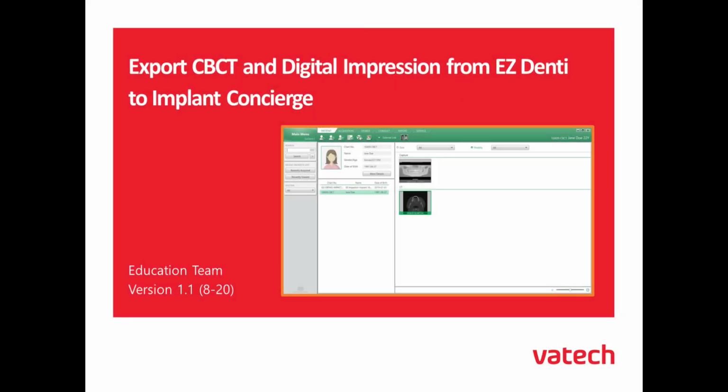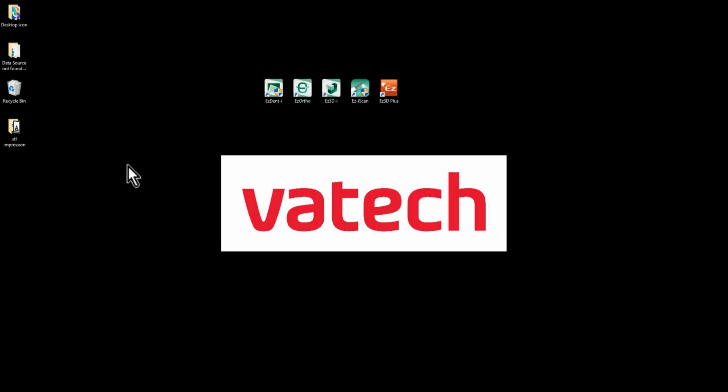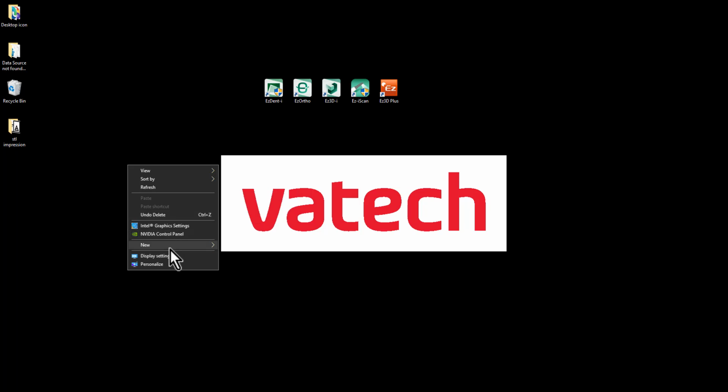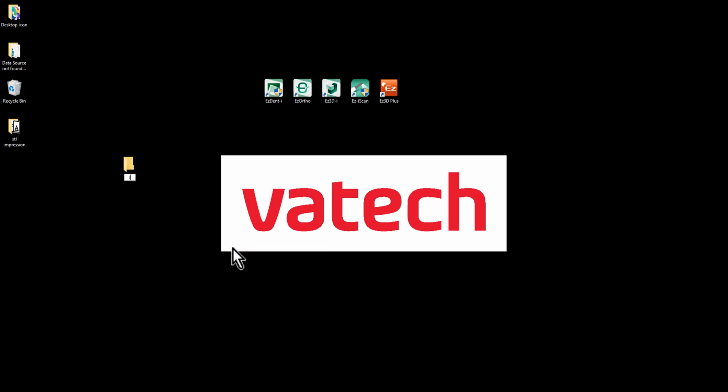In this video tutorial, we'll go through the steps to export a CBCT from EzDent-i and upload it to Implant Concierge. The first thing we'll do is right-click on the desktop and create a desktop folder and name it after our patient that will be exported.